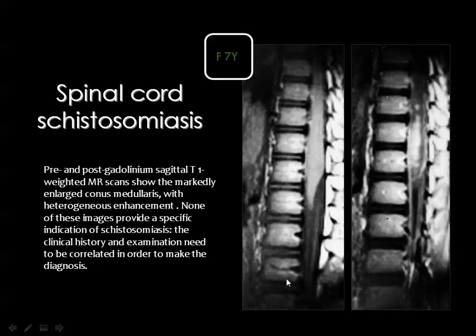After contrast injection, many times you get nodular and patchy enhancement within the affected conus. And this classic appearance may obviate the need to biopsy this lesion, because early in the MRI days, we used to diagnose this as ependymoma of the conus, and this misdiagnosis has resulted in many biopsies.